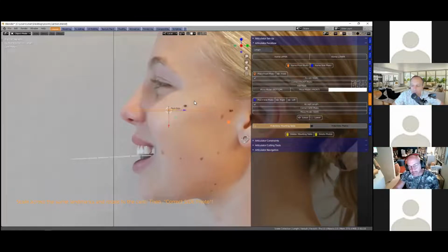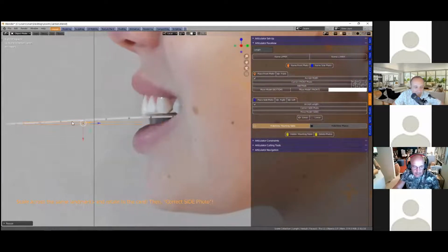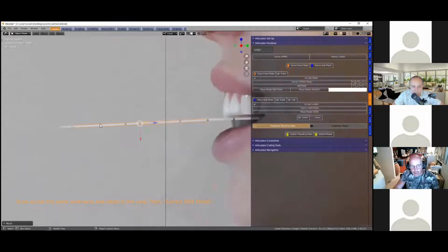Then exactly like the procedure before, we're going to grab this and scale it across the 5 markings. So 1, 2, 3, 4, 5. Scale, and we're going to rotate this as well. So there, and scale it. Try to be as accurate as you can, using the G and the R key in Blender. I think that should do the job. Yeah, it's looking good. We've got it over 5 markings, so 50 millimeters.